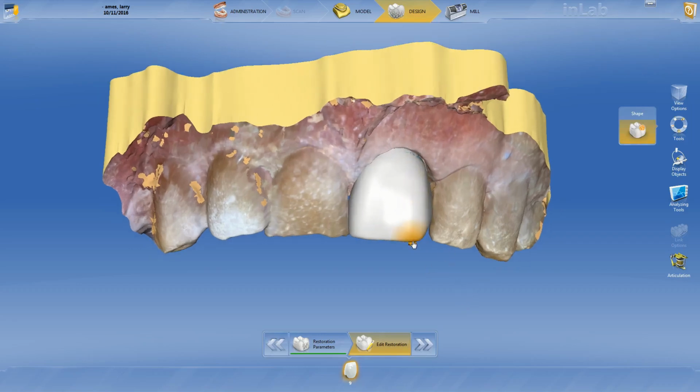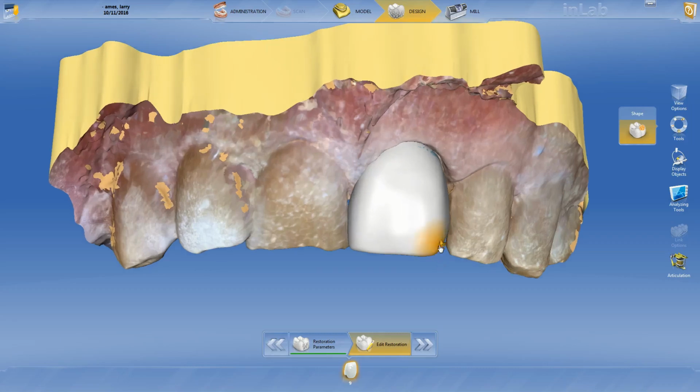And I use that a lot. And you can do it from this direction or from this direction. And depending on how sharp you want it, if you don't want it very sharp, increase the size. If you want it very sharp, decrease the size, and you'll get more of a sharp edge. So there's a sharp, decrease it, and now you're going to make something really sharp.